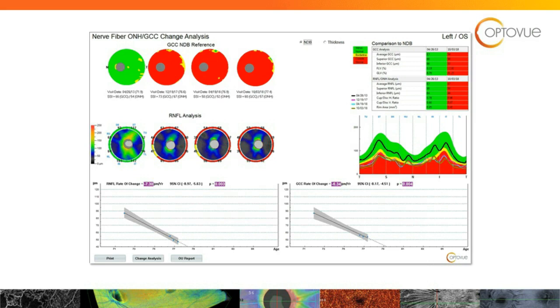All right, last question, and then we will finish up. In the nerve fiber layer analysis of raw data, how much change would be significant for a particular quadrant? Yeah, in the raw analysis, I don't necessarily look at that circumpapillary scan and say, okay, how much is significant, how much is thinning?